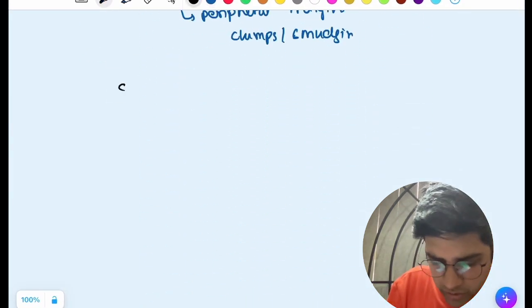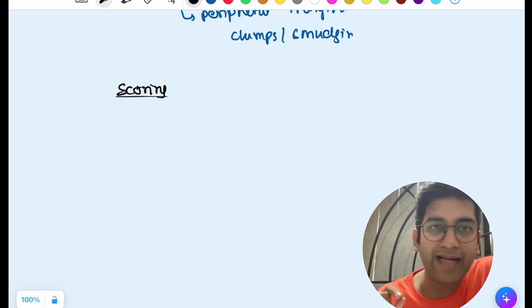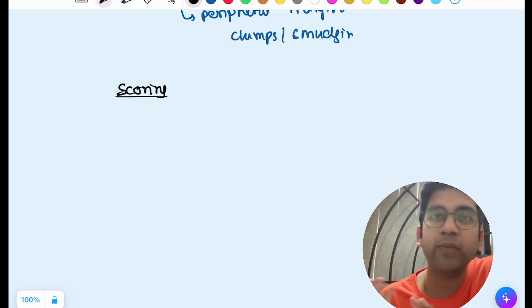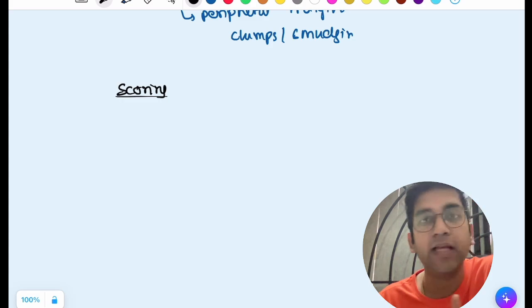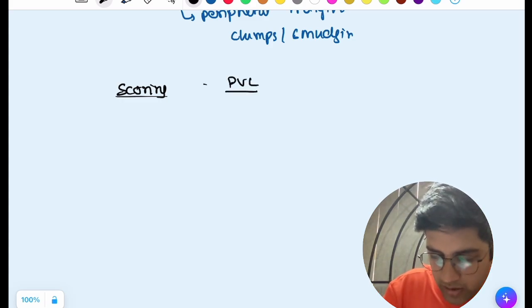So when you come to the scoring system, there are two things. One, you score the polyomavirus load. Along with that, you add the Banff classification for the tubular interstitial fibrosis and inflammation, right? I'm not going into that part. That's a separate thing. We'll discuss it sometime separately, right? Now let's look at the PVL scoring alone. We call it the polyomavirus load, that's polyomavirus load scoring, right?